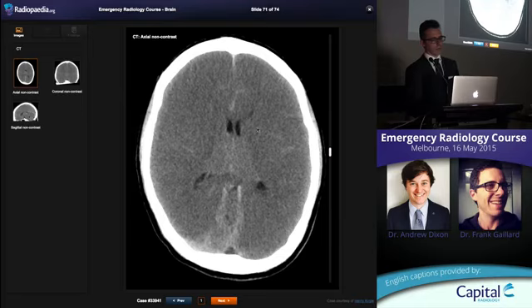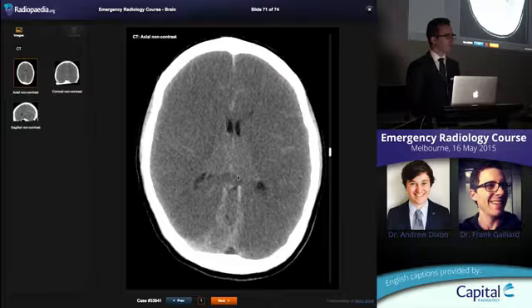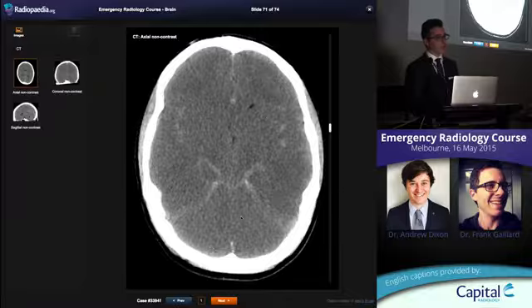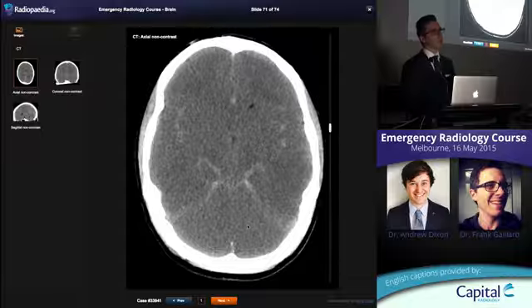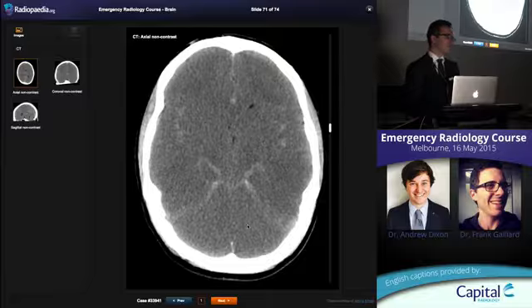There's no cortex, there's no caudate, there's no lentiform nucleus. This was an 18-year-old guy who had an arrhythmia and had a VF out playing soccer and got CPR for a bunch of hours before getting to it, and it was all too late. Sometimes, in his case, even his cerebellum is gone. Often the cerebellum continues to receive flow from the posterior circulation, and so the cerebellum looks really bright compared to the rest of the brain. And that's a helpful hint that something bad is happening supratentorially. This is not something that you should agonize over missing, because if you miss it, you're not missing much, right?